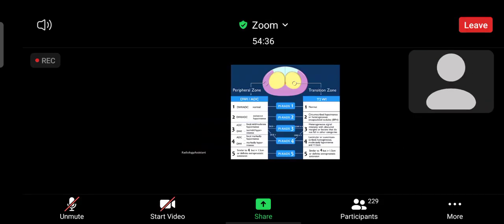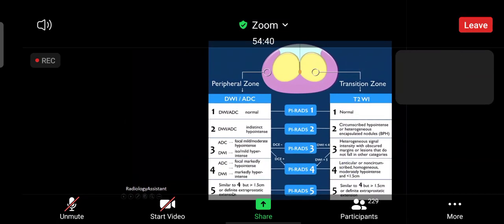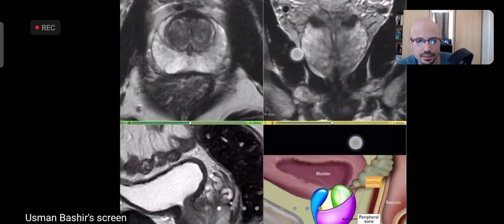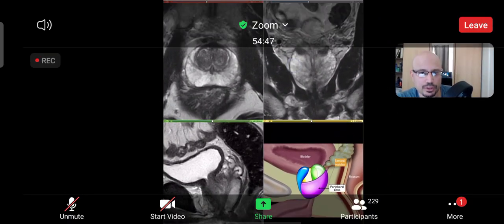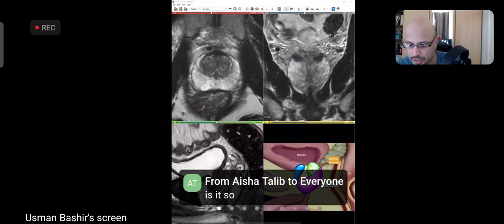Right. So I'm going to show you how I interpret prostate. So I'm starting my day with reporting MR prostate, and this is how I.